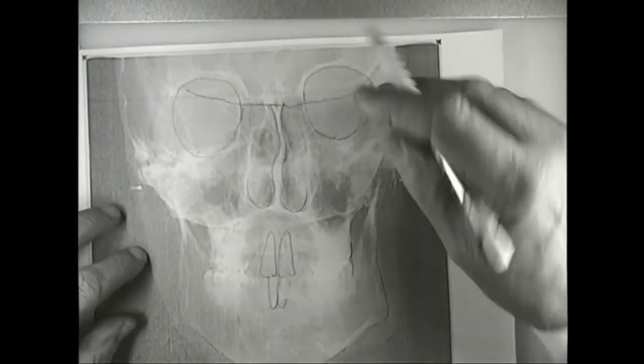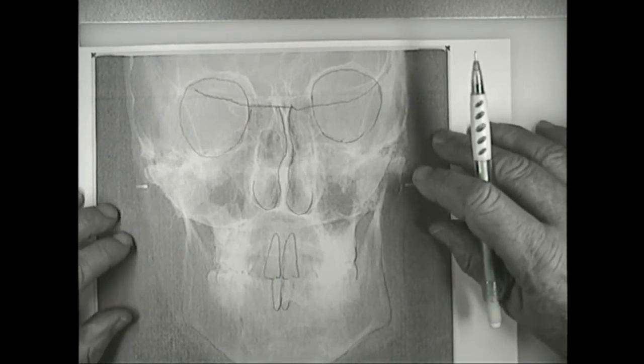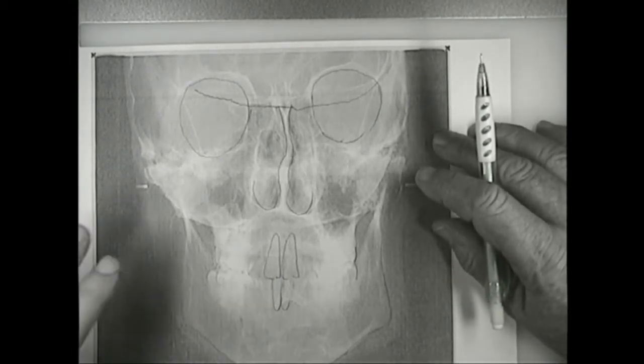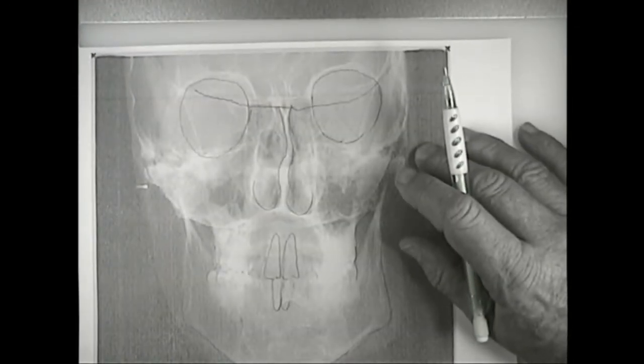Okay. Oh, that's great. You see that? Yeah. Okay. So I've just traced the outlines. I would normally trace a little bit more, but now for our purpose, I've just traced the outlines.